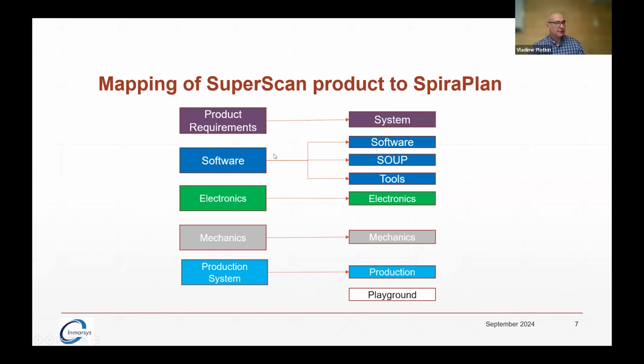And here, instead of one project, one-to-one, like it is done at the product level, I'm creating 3 projects. Why 3? One will cover the software requirements only, what is normally known as SRS.